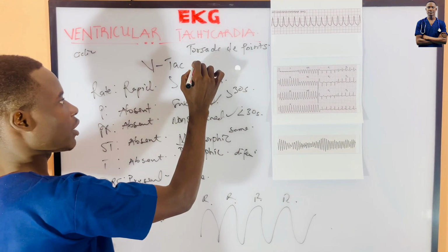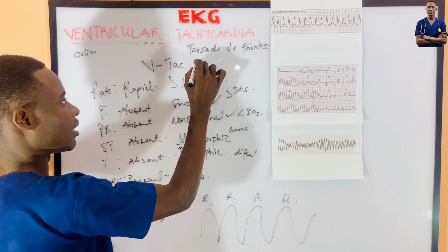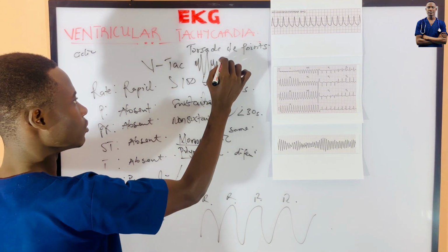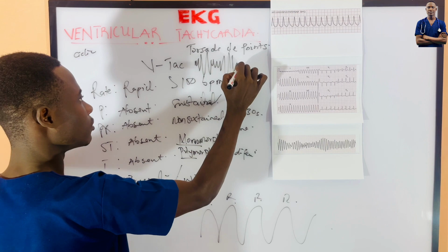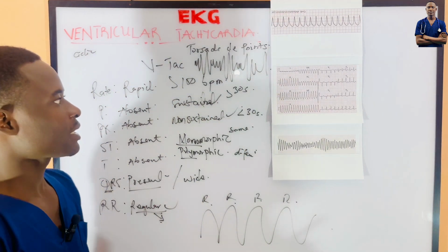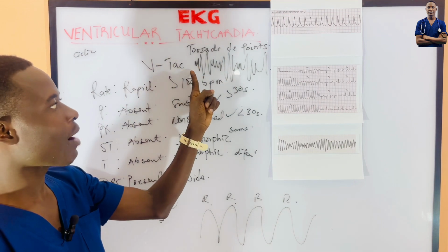The torsade de pointes is happening like this. So this is how the torsade de pointes happens.